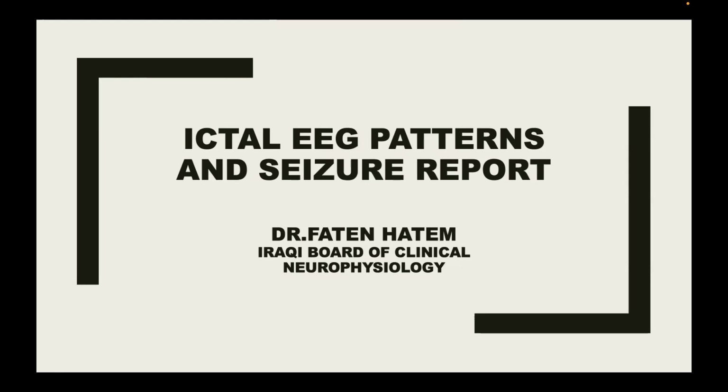Whether it's awake, sleep, prolonged, or even a few seconds or a few hours, the ictal pattern should be clearly and significantly identified. As an EEG practitioner, we should know about this pattern. We focus on focal abnormality.